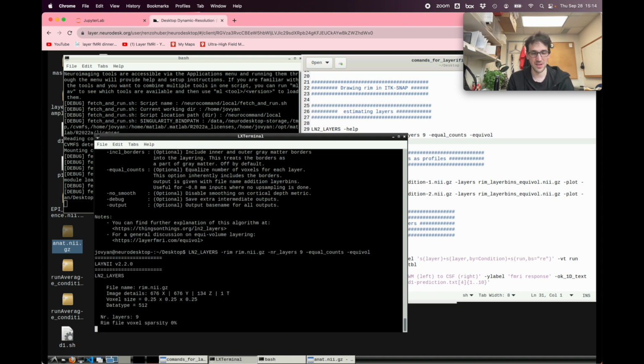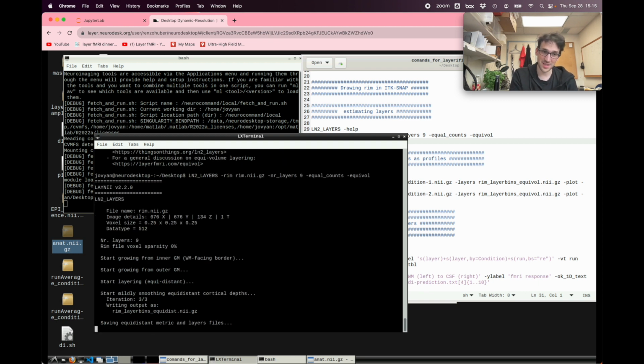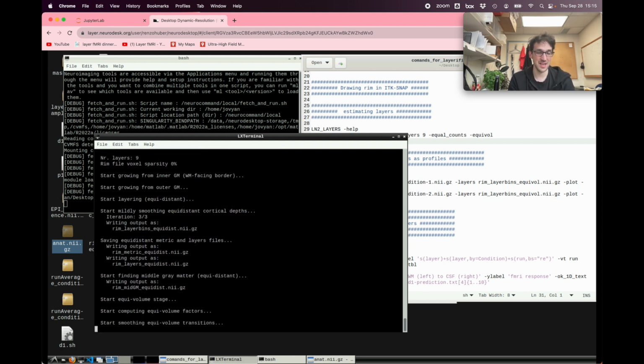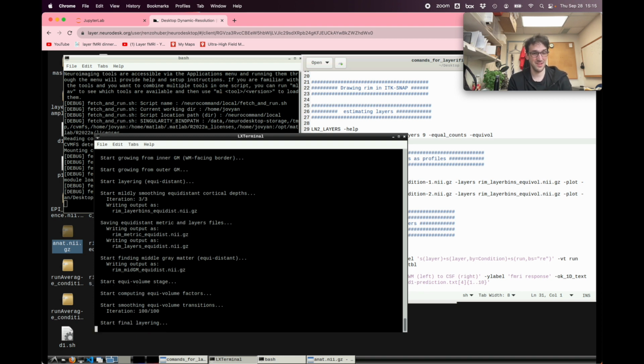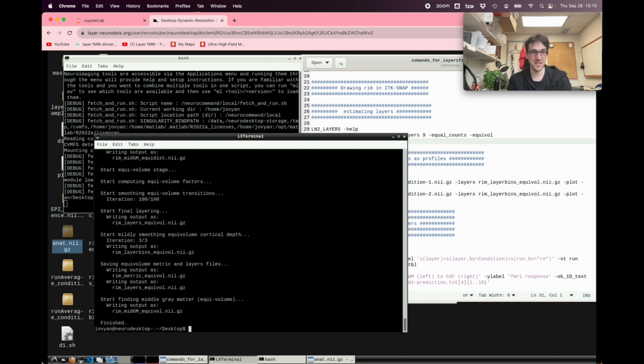which would be, I think, a good estimation for maybe the 0.25 millimeter resolution that we are working in here right now. This does not mean that the data were originally acquired at that resolution, but they were basically upsampled to that resolution. That does not mean that the number of layers that you have is actually your ultimate true effective resolution, but it allows you to have more smooth layers, and like in any histogram, it's a choice of your bin size. And usually I advise to use as many layers as possible, as we heard from Camille's talk already.